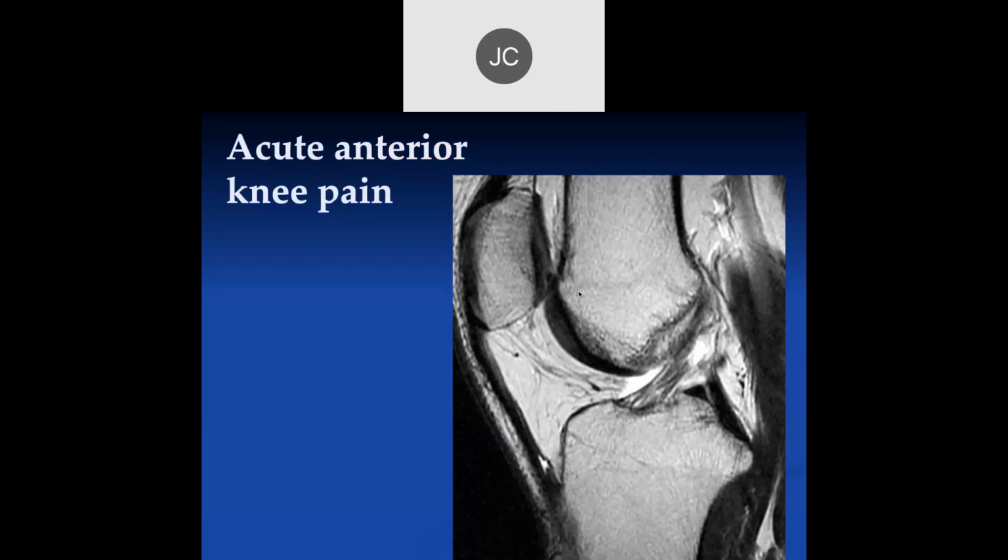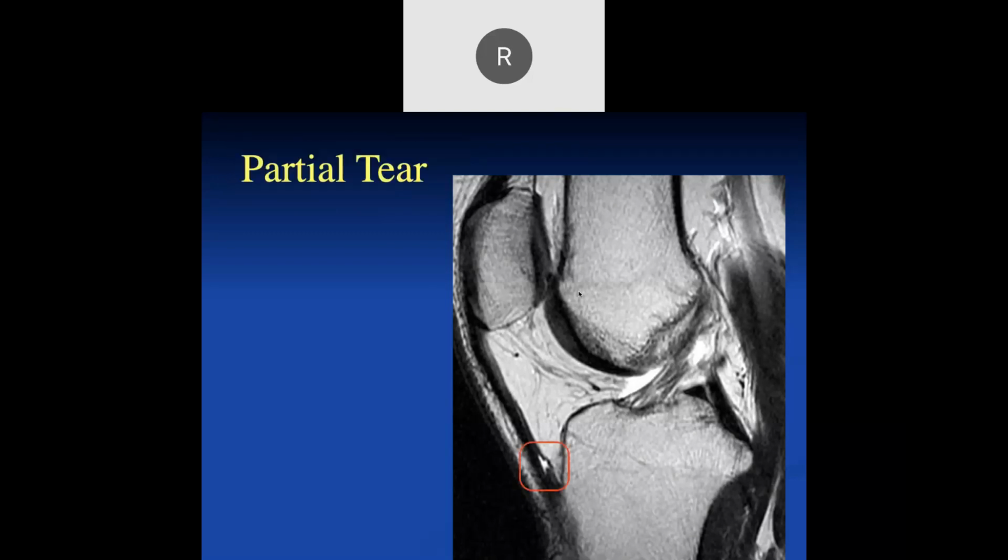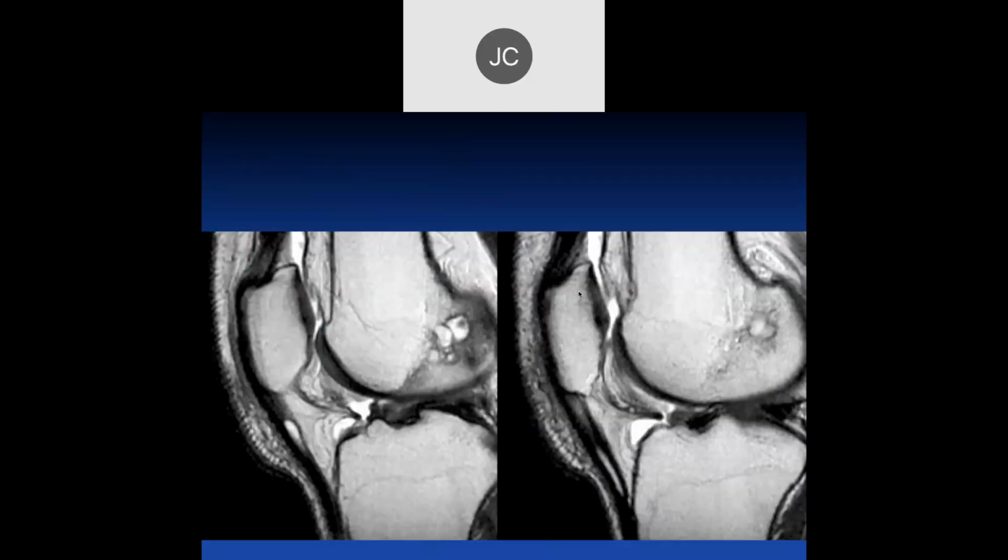Here it looks like there's a partial tear of the distal patellar tendon. Yeah, so this was a little partial tear. It was symptomatic, and this was treated conservatively, and the patient got better over several months. Okay. Tayson?